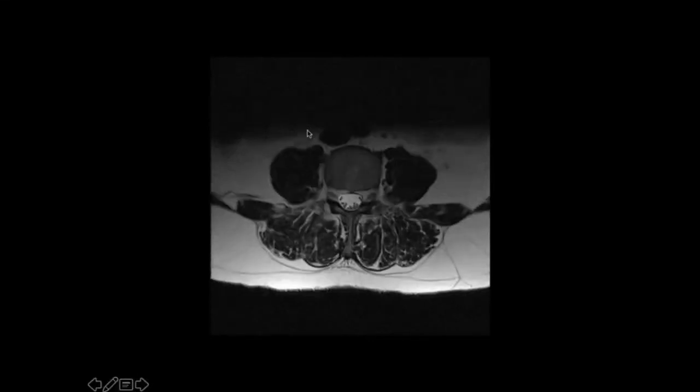Also look at the prevertebral areas as well. Obviously, you look at the aorta and the IVC as well. There can sometimes be pathologies in that particular area which can easily be missed. Paraspinal lymphadenopathy is again something which is important not to miss.